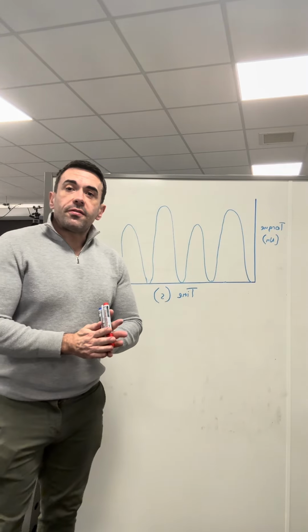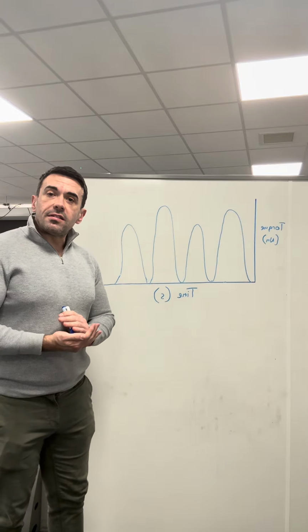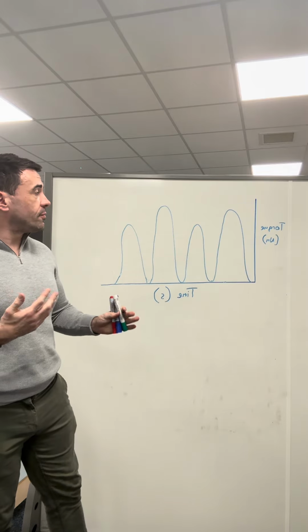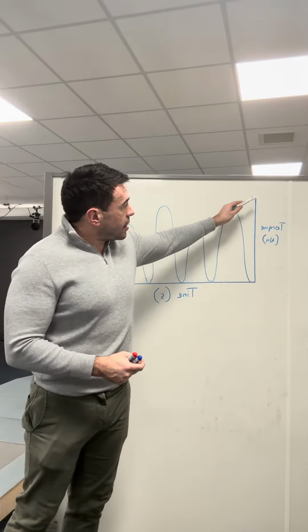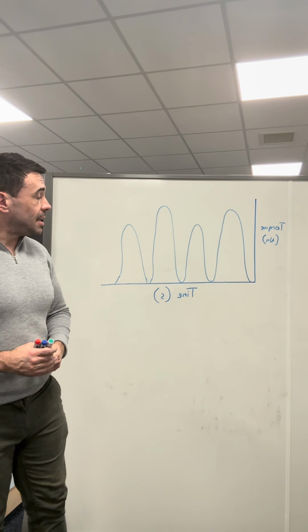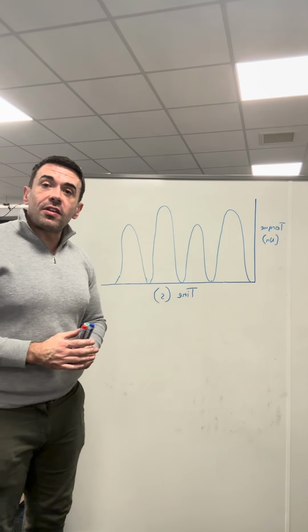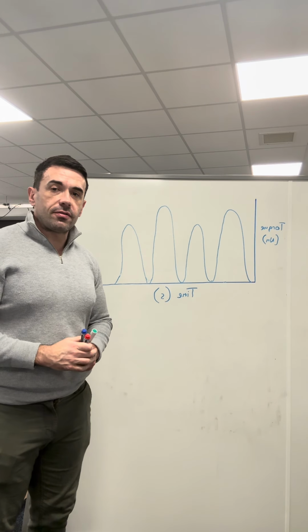Okay, this is just a quick video to give you a graphical overview of the sort of data that you get from an isokinetic output. First and foremost, we have the graph itself. Up the y-axis, we typically have torque, which is measured in Newton meters, and on the x-axis we have time. Therefore, this is a torque-time graph.